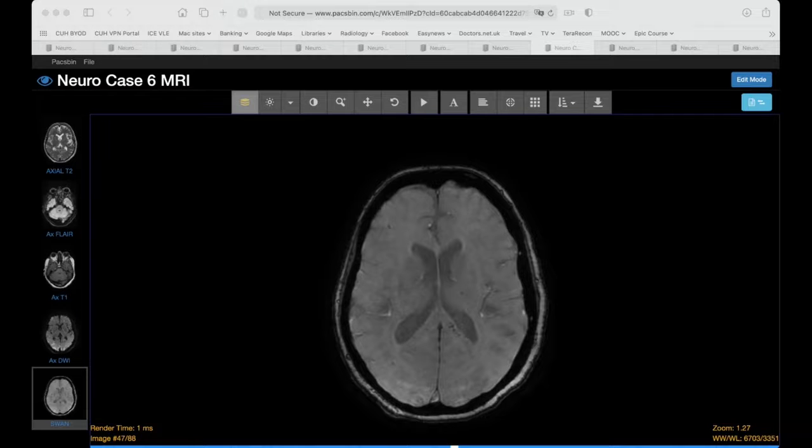So we did see a case of amyloid angiopathy before. Of course, there's no reason why I would show you a second one. Cerebral fat embolism. This is diffuse axonal injury related to her trauma that led to her hip fracture. Is something else going on? Is she septic? And she's got disseminated intravascular coagulopathy, DIC. Actually, have I withheld some of the history? She had a recent cardiac surgery, was put on bypass and therefore ended up with this kind of picture.